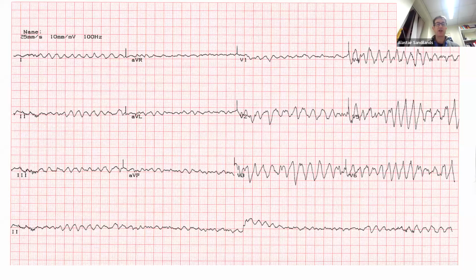A really spot diagnosis now. They have recorded a 12-lead ECG for this patient, which is interesting. So you can now see that it's very disorganized electrical activity, chaotic activity. It's not discrete. The pattern is very small, a very narrow sort of window. It's not discrete, it's chaotic. This is obviously ventricular fibrillation.